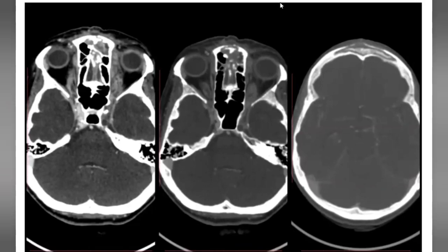Your differential diagnosis, please. You described it nicely, just sum it up.